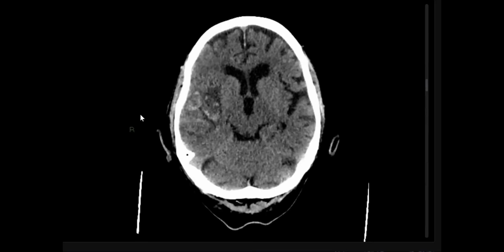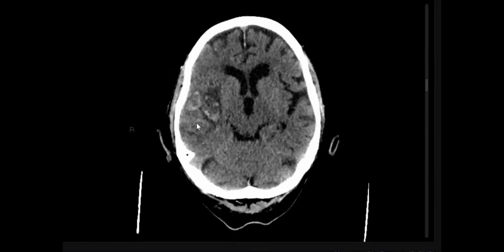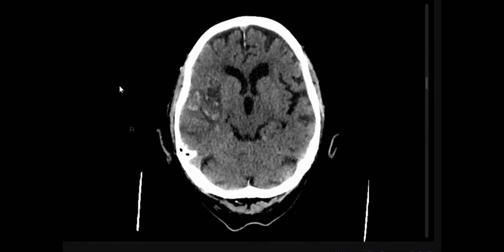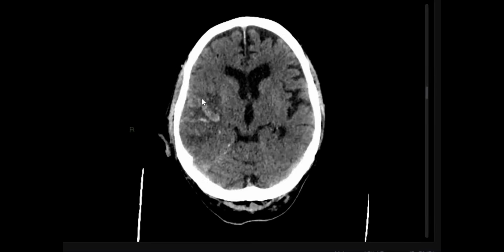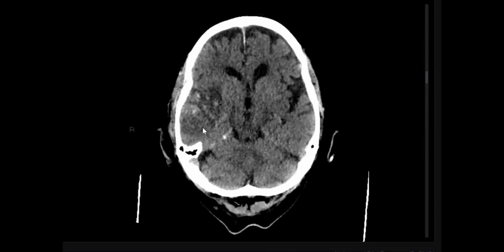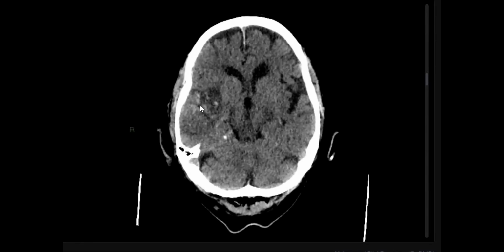So the diagnosis: post thrombolysis, or even without thrombolysis, if you see this pattern on follow-up, it is called hemorrhagic transformation, not hemorrhagic infarction from the start. Unlike venous infarction, which could be hemorrhagic from the start. Here, along the middle cerebral artery territory, hemorrhage within the infarction occurs in less than 15%, and it occurs after some time. So this is hemorrhagic transformation.